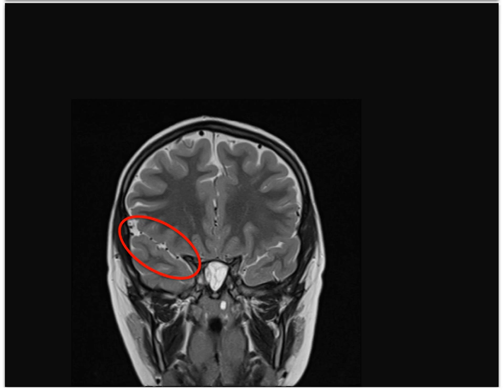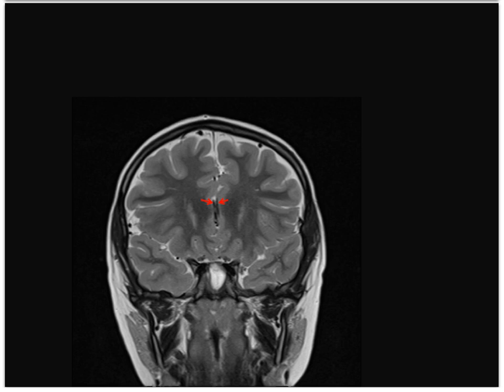And moving farther back, we see that the lateral or sylvian fissure goes over several slices, and once again we see the black dots representing branches of the middle cerebral artery. This image shows the anterior cerebral arteries on each side within the longitudinal fissure, just in front of the genu of corpus callosum.